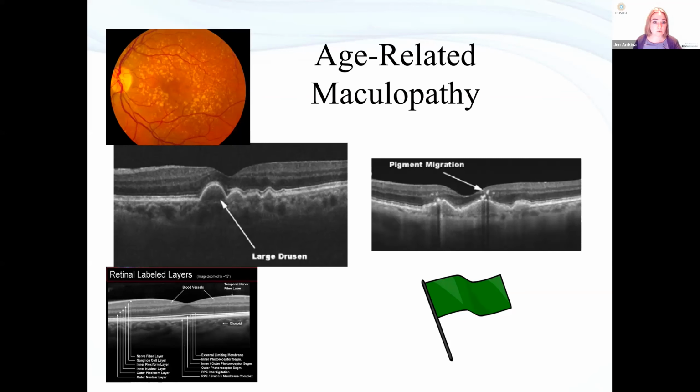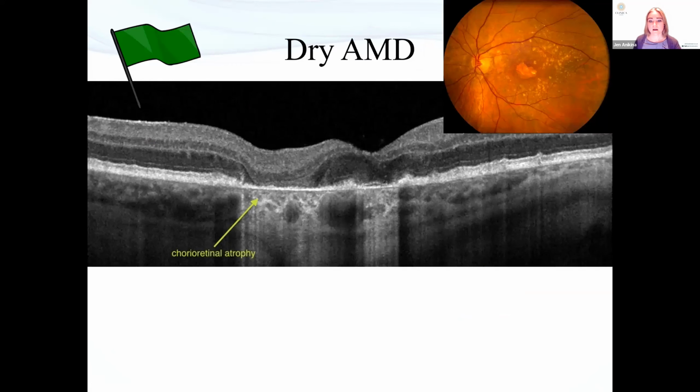These patients need supportive treatment. They need low vision clinic appointments, and sometimes they may need low vision registration, so we'll see those. Again, dry AMD, but this just shows so nicely. This is geographic atrophy, and you can see how in that area you've completely lost all of your outer retinal layers, not just the photoreceptors, but all of the associated supportive structures with them. And you've got this top layer sagging through and sitting on the bare RPE.